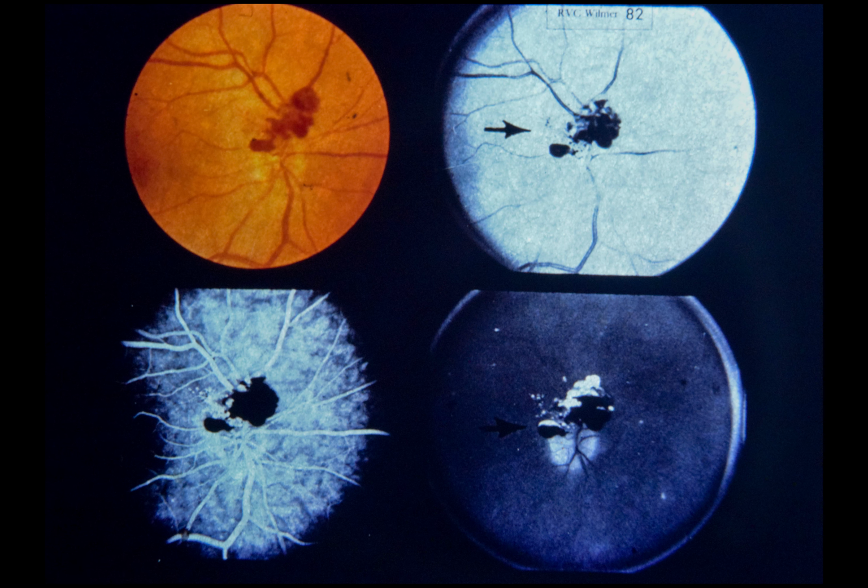Upper right, smaller aneurysms are more apparent in red-free light. Circulation within these aneurysms is extraordinarily slow, and filling is often delayed until the mid to late venous phase. Lower left, 26 seconds after injection, is the first appearance of dye in aneurysms. Ordinarily, there is no significant dye leakage into retina or vitreous, although dye may persist within the aneurysm itself 1 hour or more after injection, as seen lower right.